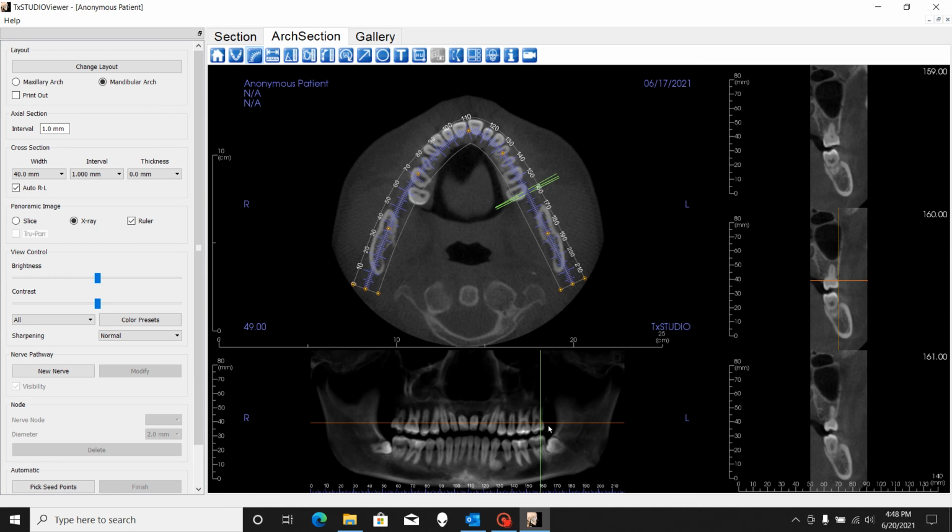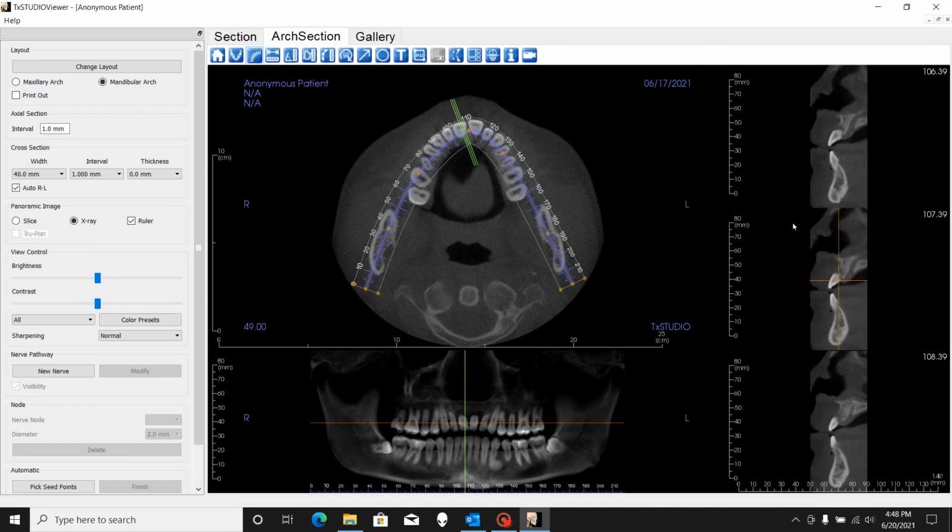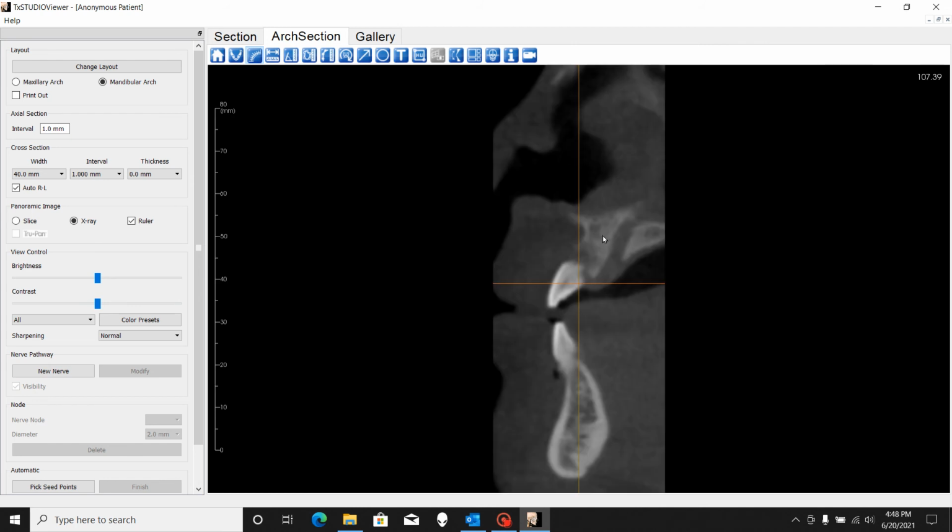So I'm going to move through a little bit and come back forward. So we have kind of a nice incisor here, and if you were doing an angle, you might want to come from this point. Oh, angle. Here's my little angle icon. Let's see if it wants to behave this time. This point to this point to this point, and that gives you your degrees and such. So that's a way to do angular measurements, with that particular icon, the fifth one, the angle measurement.